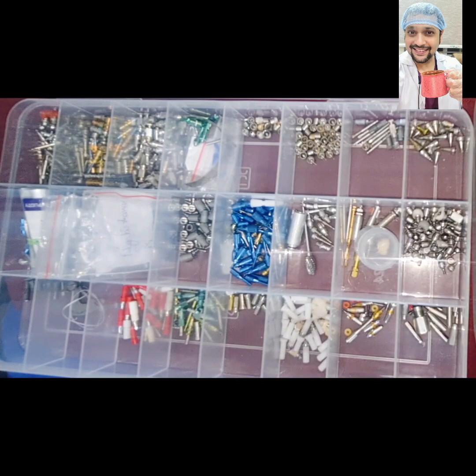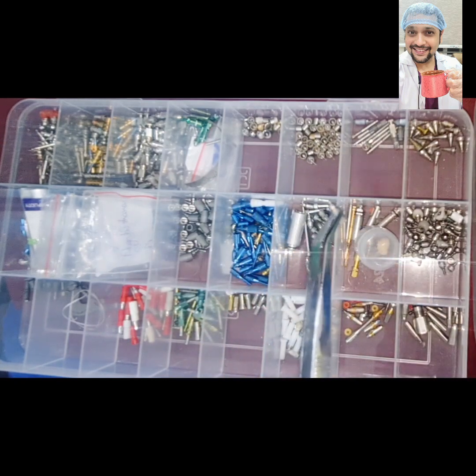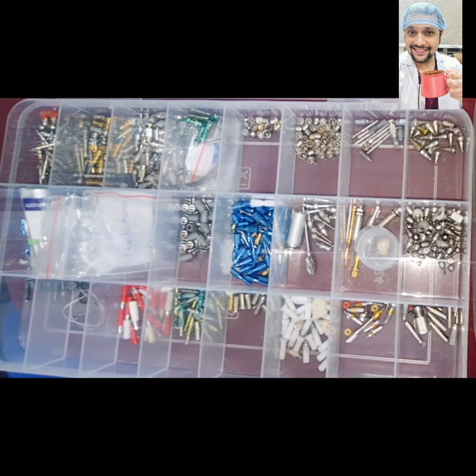When it comes to the milled and DMLS, what we have to understand is once we place the scan body into the implant and we scan it up, the printed cast which the lab person has will be utilized for either the milled or DMLS. It is lab part. It is not in our armamentarium when it comes to the milled or the DMLS or the printed, because from the scan everything is done.